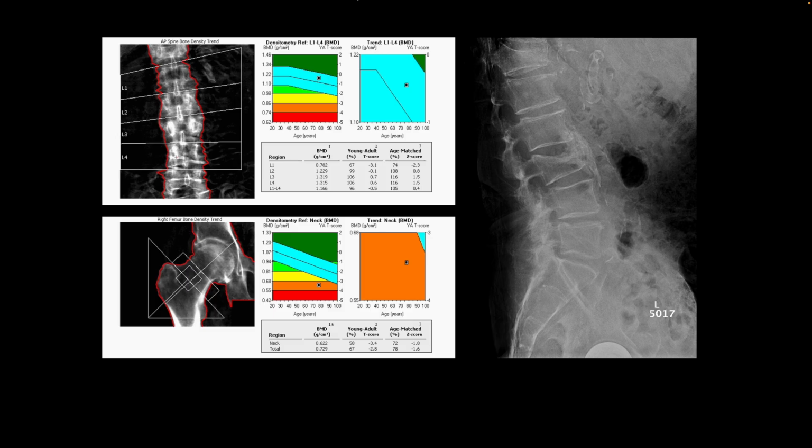This is an interesting DEXA scan. We have the image of the lumbar spine and the image of the right hip. The lumbar spine image shows that the L3 vertebral body has a height which is smaller than the one vertebral body above, L2, and the one below, which is L4. So when we compare this finding to their prior studies on the plain film, we find that in the lateral view they have compression deformity involving the L3 vertebral body, and so this would be an insufficiency fracture.